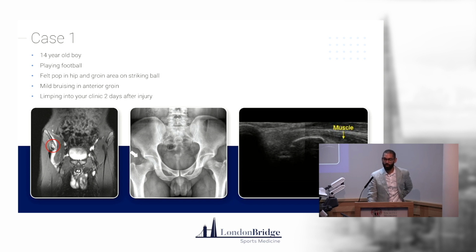What have they done wrong with this one? Why do a pelvic X-ray of the whole thing? Why not just do a right hip joint X-ray? You've exposed him to unnecessary radiation. You could have been really focused from that point of view. Just consider that.